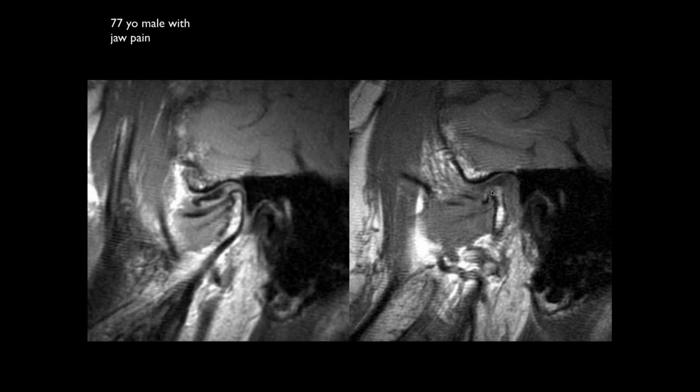And sometimes you can tell that if you do both sides. If you have adhesions, sometimes the opposite side will move normally, but the abnormal side won't, in which case it's not poor effort on the part of the patient. In that case, the patient is opening the mouth because one side's moving properly. The side that's not moving is most likely due to adhesions. So in cases like that, having bilateral can sometimes be helpful.